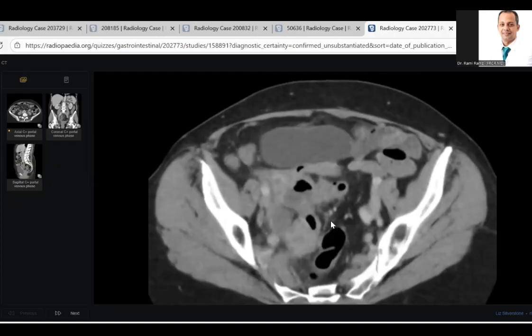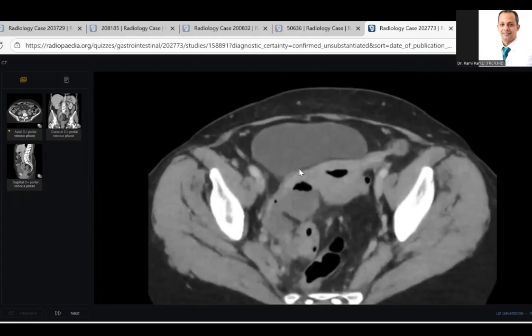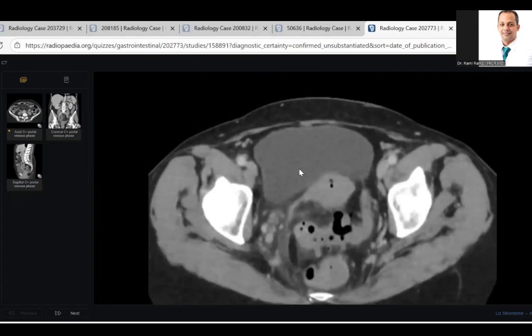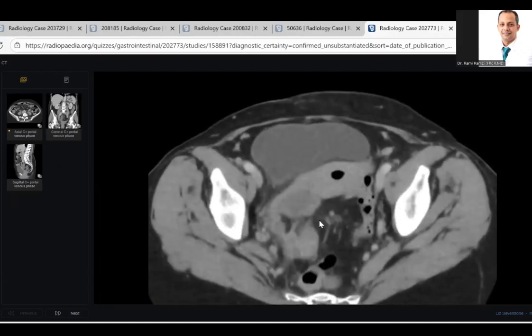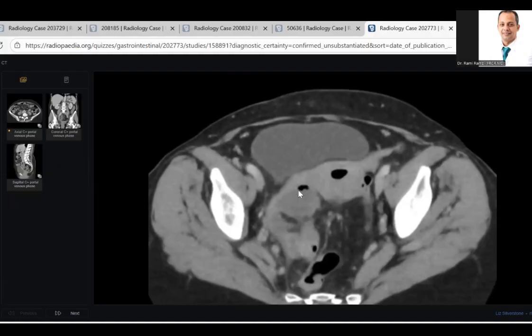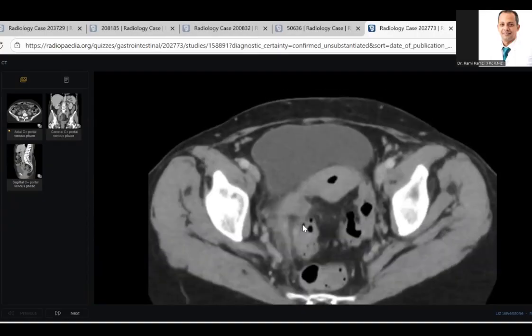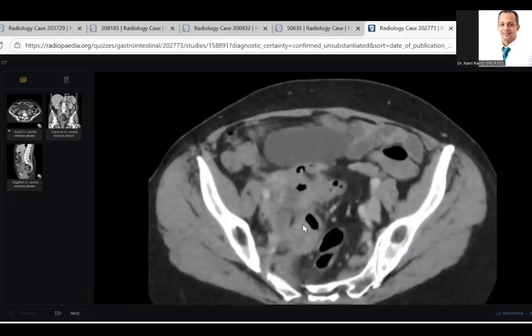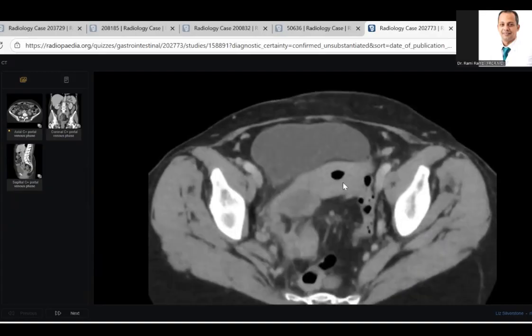The next step, see, look here, my colleague, look at the tube mainly. The next step, surgical intervention. I think no hysterectomy is needed here. Why hysterectomy? I think the repair here is related to the diverticulitis and maybe to this tube, this right-sided adnexa. Okay. If the examiner asks you how you could be sure or confirm your diagnosis, give a rectal enema of water-soluble contrast. Okay, you will inject it inside and you will see it inside there.